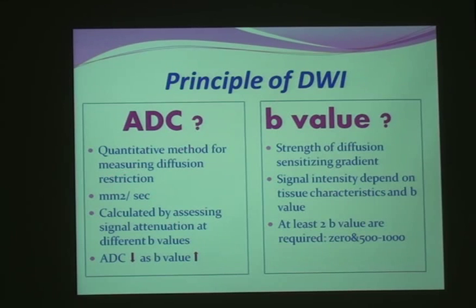As we know, the ADC map usually is the negative logarithm of the diffusion weighted image. If a lesion is really restricted diffusion in the diffusion weighted image, it will just appear dark in the ADC map. Yet if it is bright in the diffusion weighted image and bright in the ADC map, we wouldn't consider it as diffusion restriction, and it's just what we call T2 shine through.